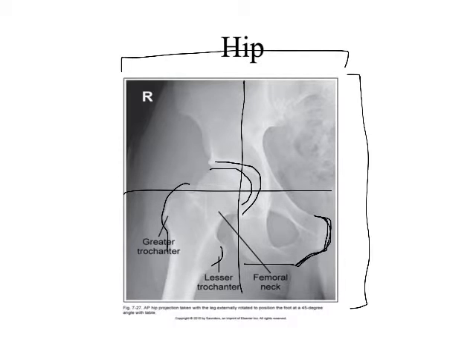And so we might talk about some of the measurements that we might use just for the grayscale on this image, which would be muscles like the gluteus, the iliopsoas muscle, right? And these striated muscular patterns in here. Those let me know that I have an adequate amount of contrast between the bone and the soft tissue around it without completely burning the image out.